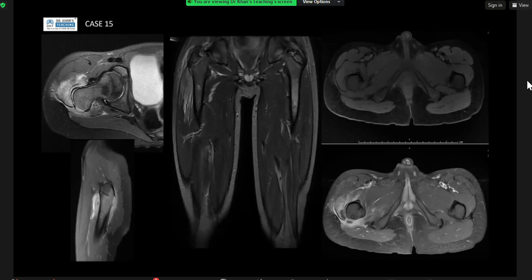Okay, thank you. And this is osteomyelitis. So you've got soft tissue edema, you've got this periosteal elevation, and this is a T2 fat suppressed, and you can see marrow edema as well here between the greater trochanter and the epiphysis, the metaphysis. And this is apophysis, which is similar to epiphysis, just that it doesn't add to the lengthening of the bones.